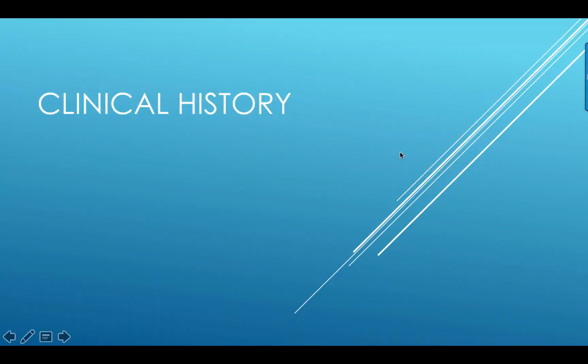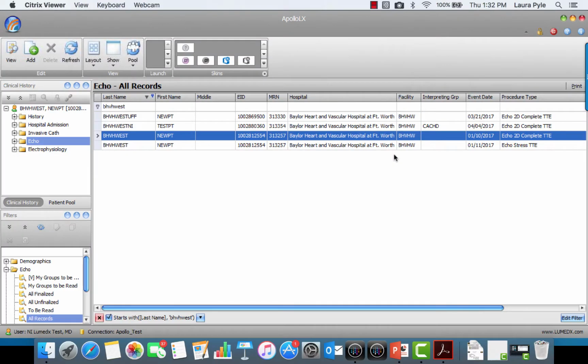Clinical history. Whenever a patient is selected in the patient grid, or if a workflow is open, the clinical history for that patient is displayed in the clinical history pane on the top left side of your screen. The clinical history displays different cardiac events associated with the patient. Let's take a look at the clinical history of patient BHVH West, new PT.